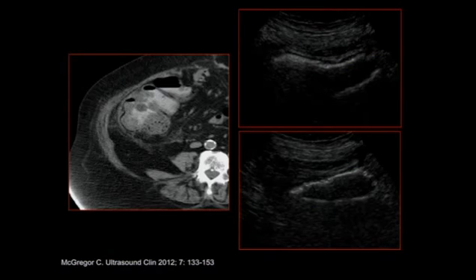The second scenario in which ischemic colitis sometimes arises on ultrasound is far less common. However, I think it also demonstrates the usefulness of ultrasound of the bowel. This is an elderly patient, again, who was unable to receive contrast because of an elevated creatinine, and on the non-contrast study, we appreciated that the right colon was maybe a bit thickened. There was certainly pericolonic inflammatory change, and we were wondering if this was pneumatosis or not. It was a little bit difficult.